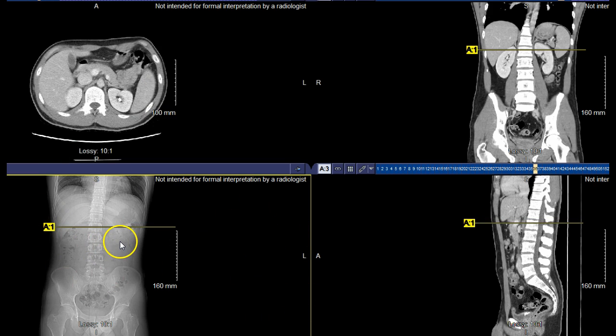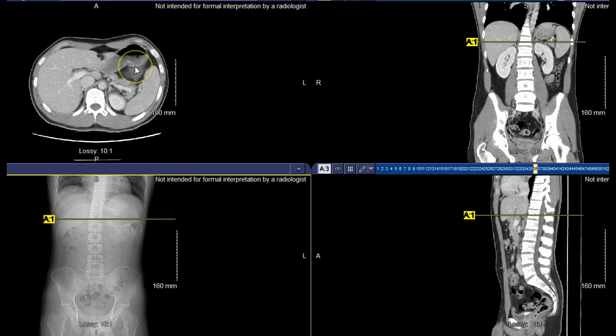to give us that localization. We can use these localizers as well. So make sure you do that. Like I said before, I've set the coronal plane and the sagittal plane at areas that I think are a little bit more helpful. That way you can keep that frame of reference and see exactly where we're at as we pan through the images.